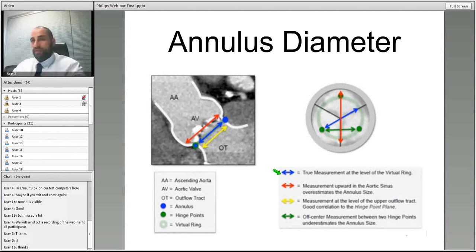So when I have to manually do this, okay, I need to work out the exact curved MPR, the exact line of fit. I need to be able to actually see the sinotubular junction, where I need to see the space between here, the actual sinuses here. When the valve does open up, it's going to push these calcified valves to the side. And this is the space, if I click here at the green box here, this is where it's going to land. If we look at the left ventricular outflow tract and this yellow line here, this is the anchor point of the actual valve.